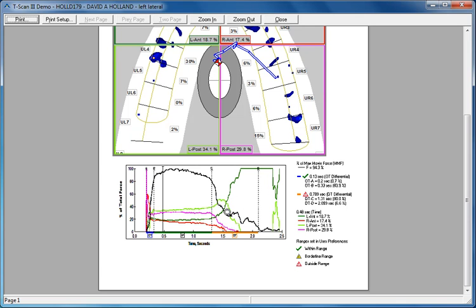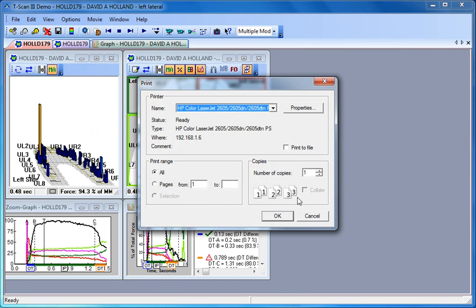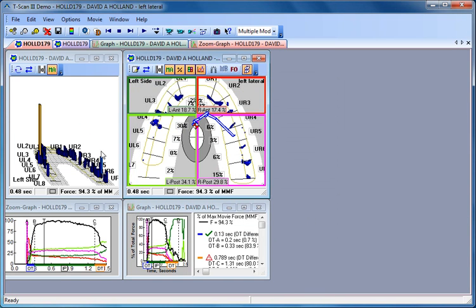And the interference is actually in this area. So this is posterior interference, so it's probably down here. Well, the point in the graph I'm on is right here. This is probably where the interference is, and I can very quickly get that, so I know what I'm looking for when I subsequently look at the real data. So that little print preview or print is fairly useful for screening purposes. It was there in version 6, it's still there in version 7.